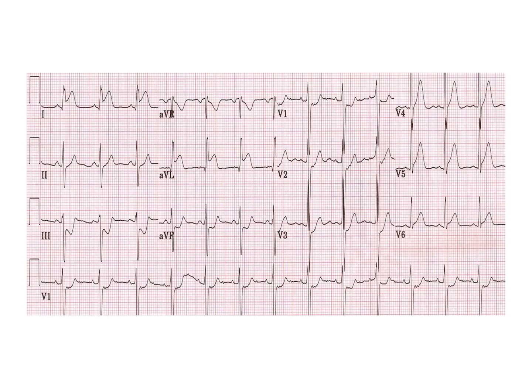Looking at this ECG, we'll notice quickly that there are very significant ST elevations on the lateral side. So leads 1, AVL, a little bit less pronounced in V5, V6. And then there are reciprocal ST depressions in 2, 3, and AVF, which all fits with a lateral MI.